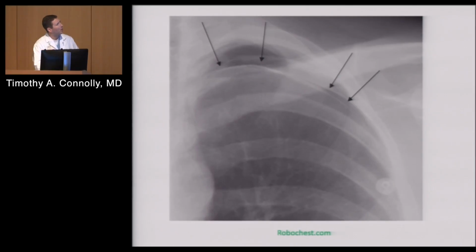So when we say follow pleura to pleura, we mean really you want to find it right against the edge here and follow it back to wherever the edge would be over here. So this is an example of a true pneumothorax. Now, that's not an enormous one. That's pretty small. So this patient is probably going to be managed just with oxygen. If they're on a ventilator, slightly different issue because you're pumping in positive pressure. That may require something more invasive.